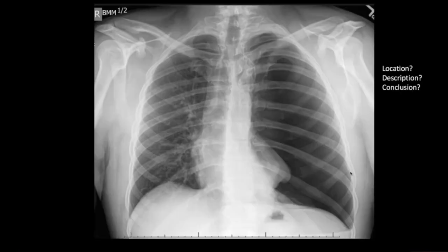But again, if I see upper lobe fibrosis, there would be other differential diagnoses, including sarcoidosis and pneumoconiosis. Pleural abnormalities on chest radiograph. On this chest radiograph, there is lucency filling the entire left hemithorax. It is devoid of lung markings. There is mediastinal and tracheal shift to the right. This is in keeping with a large left tension pneumothorax.